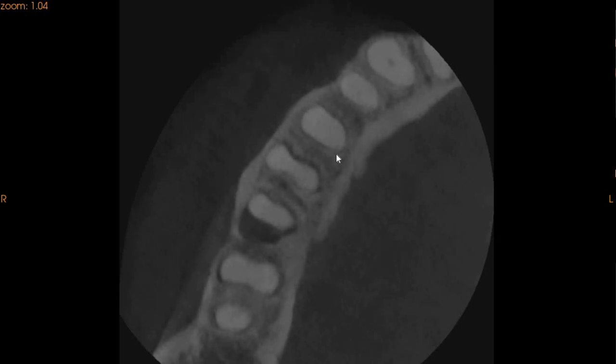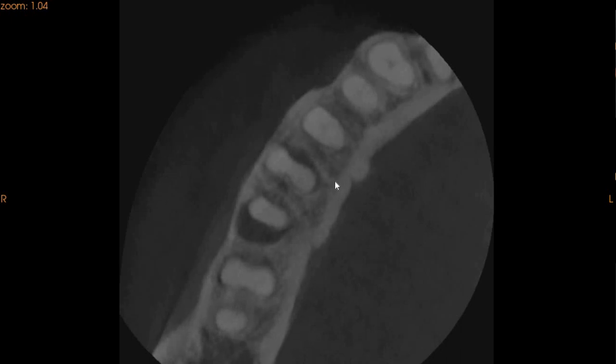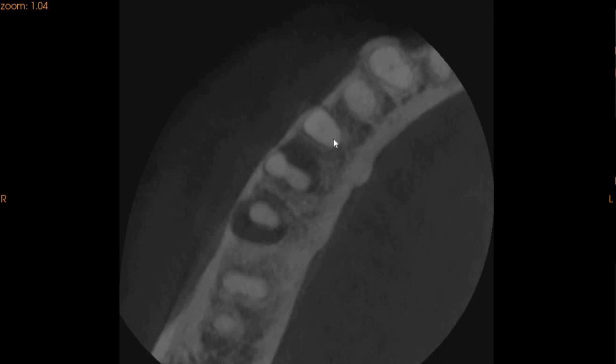We are quite surprised to see such sclerotic teeth at the moment. If you have any further questions regarding this case, the lower right 5 and 6 have periapical radiolucencies associated with them as well.